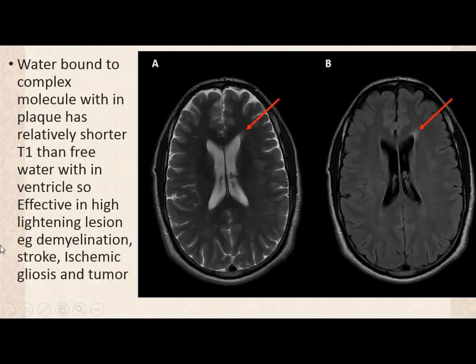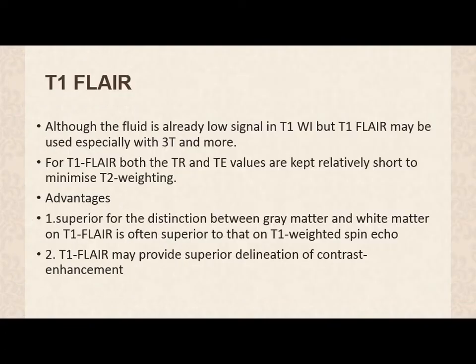Okay, for example, this is a conventional T2 weighted image, and this is a FLAIR. You can see the gray matter is bright and the white matter is dark. Okay, and exactly the same here. The gray matter is bright, the white matter is dark. When you suppress the CSF, only the fluid that is not CSF will remain. For example, increased transependymal flow will be demonstrated very nicely. Okay, or any gliosis or lesion, whatever. And it will show pathology even better than T2.